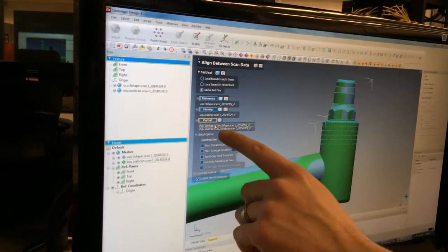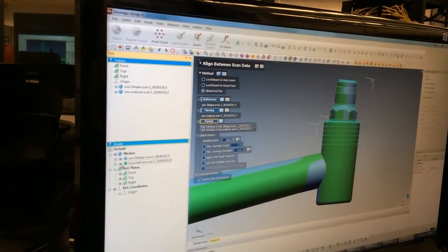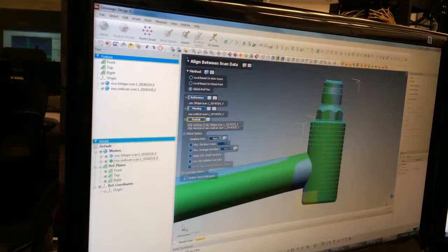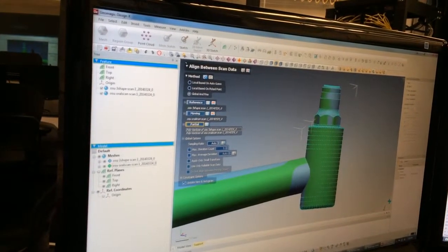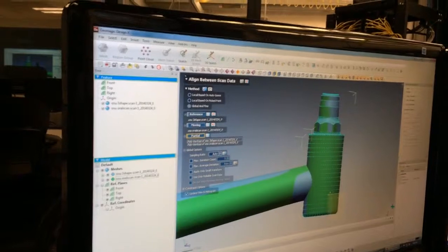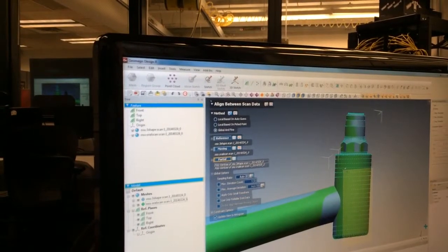So you're seeing here polyvertices of the one, polyvertices of the other. And if you need to, you can turn one off, turn the other on. And it'll keep adding to it as you go. If you accidentally pick some that you don't like, if you hold down Control and then do it, it'll take them back off. So Control is for removing. Yes, in this particular mode, because this is defaulting to an addition mode.